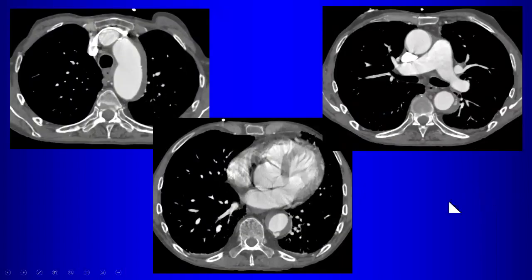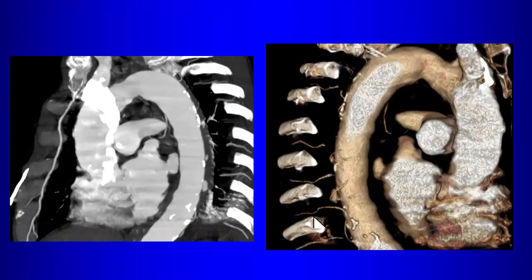Yeah, so these are called intramural blood pools. And is the prognosis better or worse than ulcer-like projection? Better, yeah, better. These tend to heal on their own. So to differentiate this from the ulcer-like projection, which has a wide mouth, these have a very narrow mouth. Right? These have a very narrow mouth.